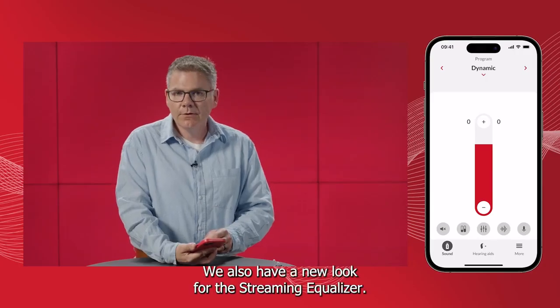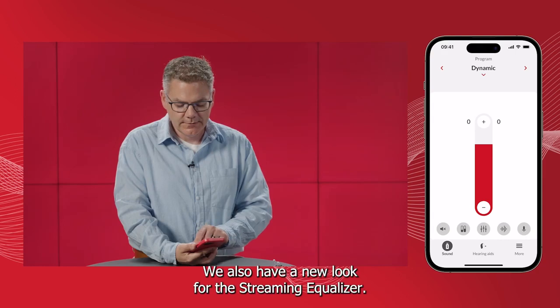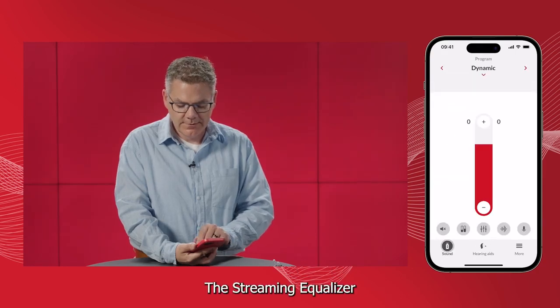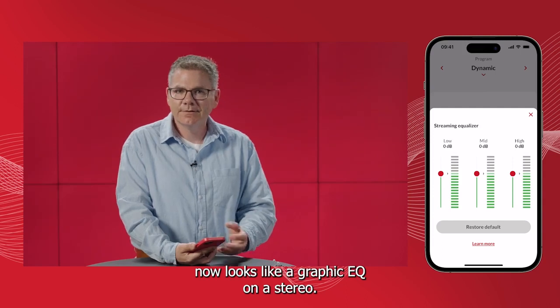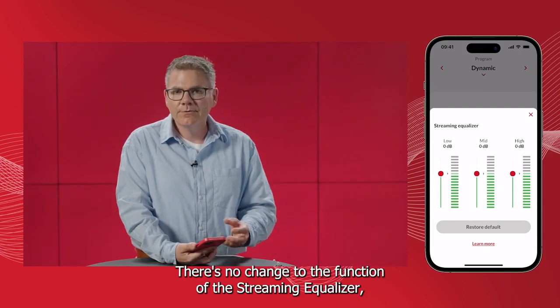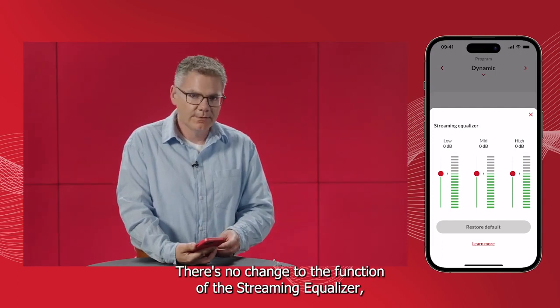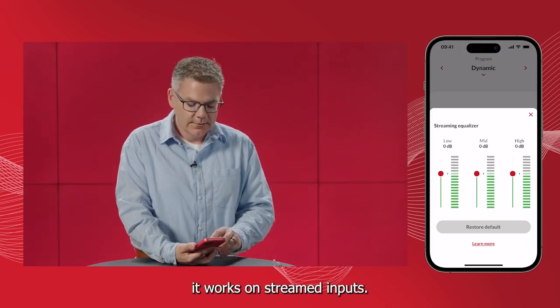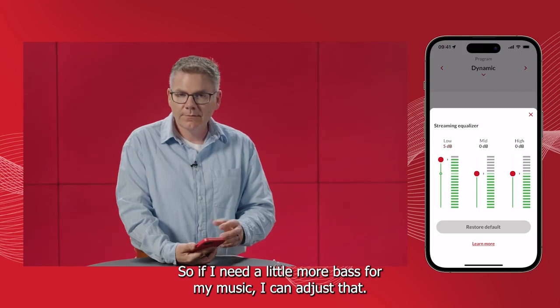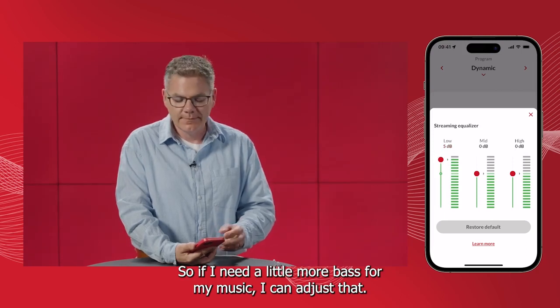We also have a new look for the streaming equalizer. The streaming equalizer now looks like a graphic EQ on a stereo. There's no change to the function of the streaming equalizer. It works on streamed inputs. So if I need a little more bass for my music, I can adjust that.